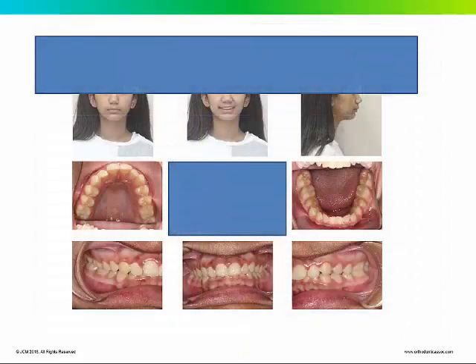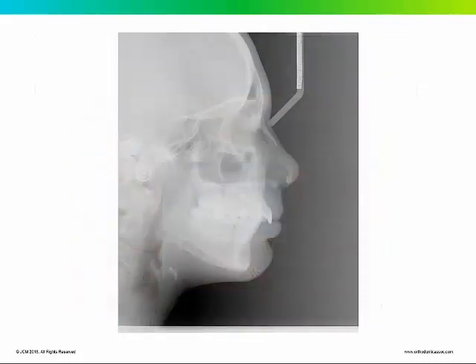This is a case that was transferred to us by another orthodontist. These are the pre-treatment orthodontic records. She, I would say, is Class 1 on the right, more end-to-end. Class 2 on the left, deep overbite, mandibular asymmetry. He treated her with a Herbst appliance to correct the Class 2. Here is the cephalometric x-ray of this patient pre-treatment, and you could see that she is really not that bad. Certainly not as bad as many of our Class 2 patients.